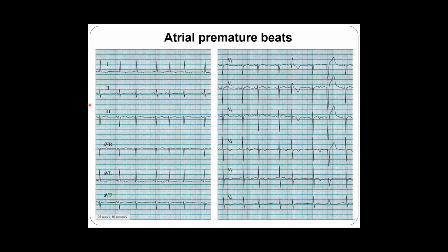And after, let's look at the morphology of the P's. Yes, we do have P, P, P, P. As you see here, this P is not the same. And how can we prove it? Let's go down a little bit, okay? Because it's consequently recorded, and this is parallelly recorded in a 6 lead. Let's look at AVL. See, that's a big difference, because in AVL, this has a little P and here is nothing. Okay, let's go to another one.